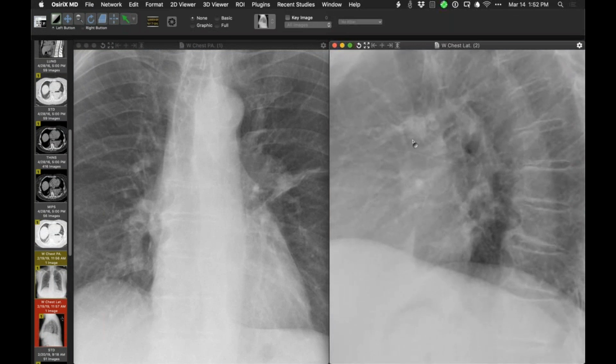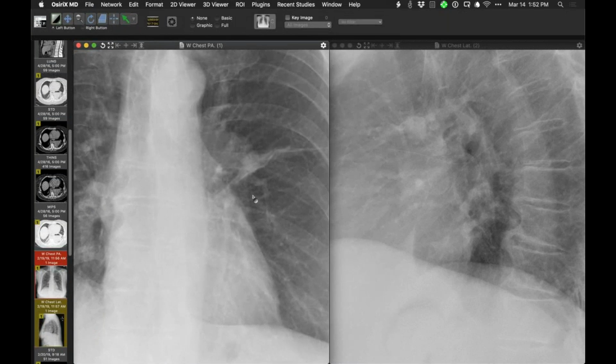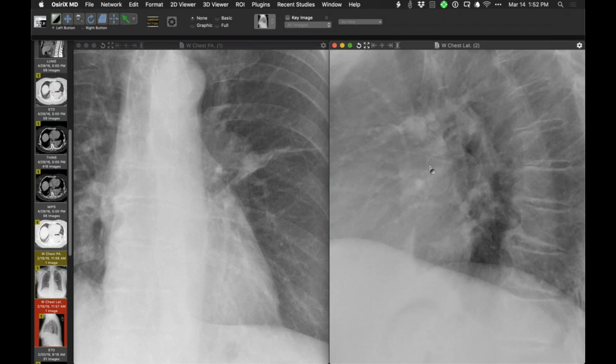And I can't remember whether I saw the thing first on the lateral, then the frontal, but got lucky because on the lateral projection, there is an opacity here, which is different from any of the other opacities one should see on the lateral projection in that location. And then I think secondarily, I said, oh yeah, maybe here there's something round right adjacent to the area of subsegmental atelectasis. So kind of a subtle finding, and got lucky.